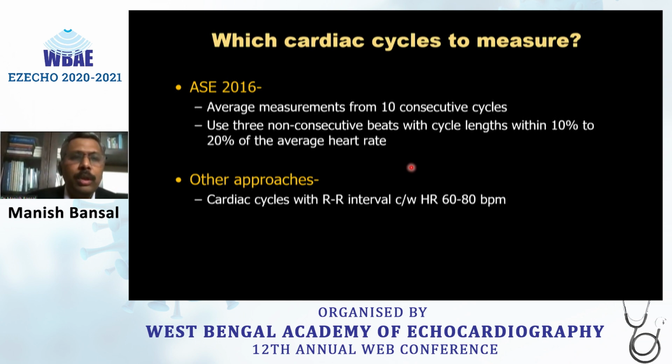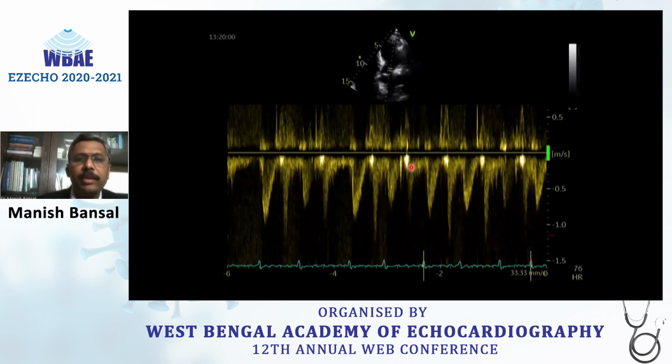Now, although guidelines recommend this, there is a problem here, and I'll explain this in this spectral Doppler pattern from the LVOT. So see here we have a long cardiac cycle. Long cardiac cycle will mean better LV filling. If LV filling is better, then through Frank-Starling mechanism, the next beat systolic function is going to be much better. And this is what we see here.